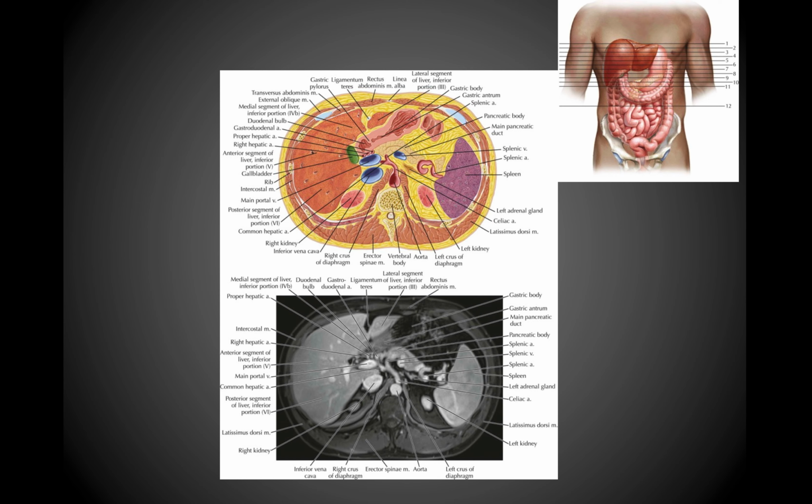So keep in mind that when we do a CT or an MRI on a patient, they are lying supine, and so it is normal to have the gastric bubble now in an anterior location as opposed to up in the fundus as we see on an upright radiograph.